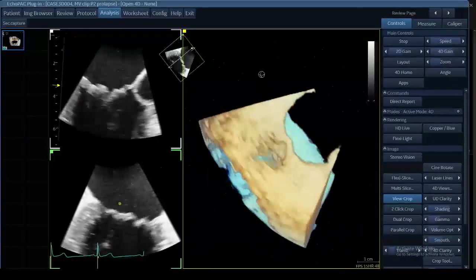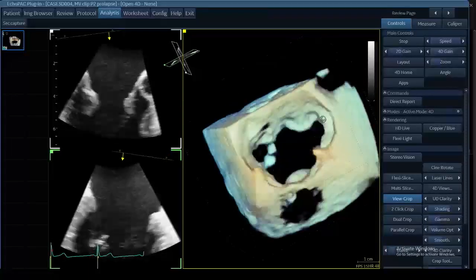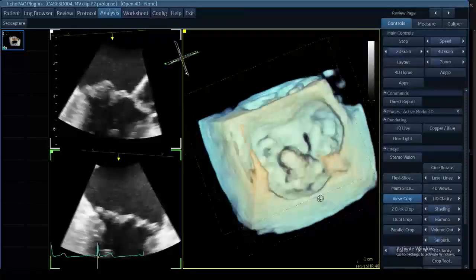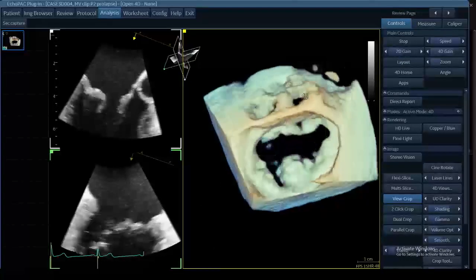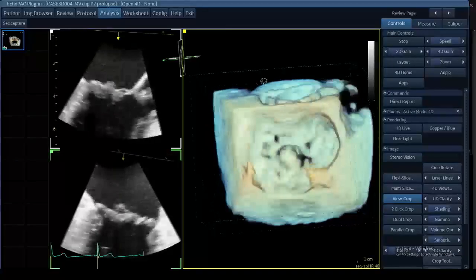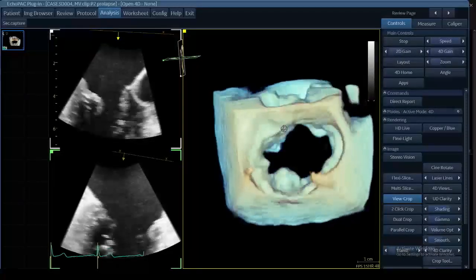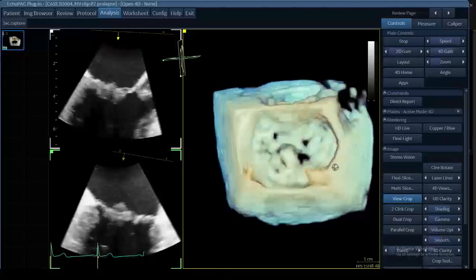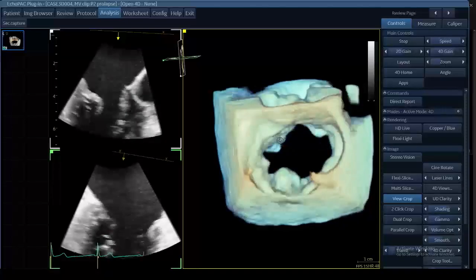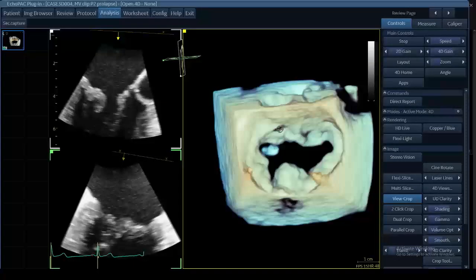Typically, before I start going into more processing, I just take a look, rotate the valve the way I'd like it to be rotated, and try to understand what's what. For the mitral valve, we tend to put the aortic valve at noon, and then we look at it top down from the surgeon perspective. Anatomically, the posterior leaflet has 3 scallops, and the anterior leaflet is just one piece, but we divide it into 3 scallops corresponding to what faces the posterior leaflet.